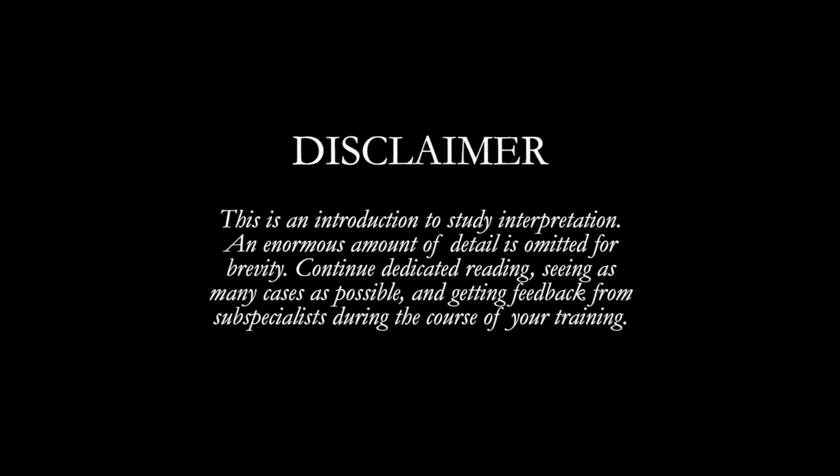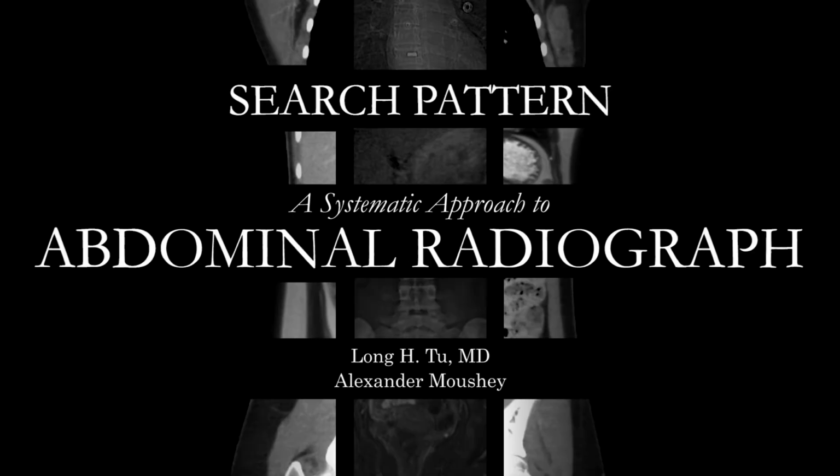Please note that this is an introduction to study interpretation. An enormous amount of detail is omitted for brevity. Continue dedicated reading, seeing as many cases as possible, and keep getting feedback from subspecialists during the course of your training. So today we're going to talk about an approach to the abdominal radiograph.